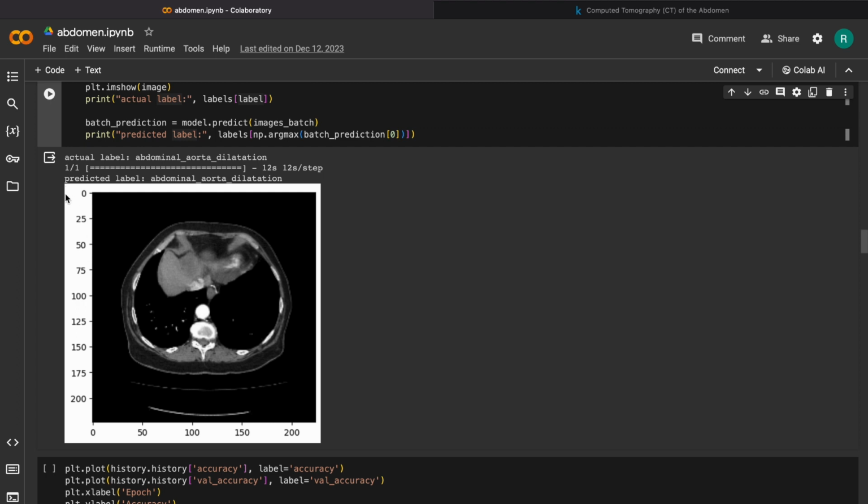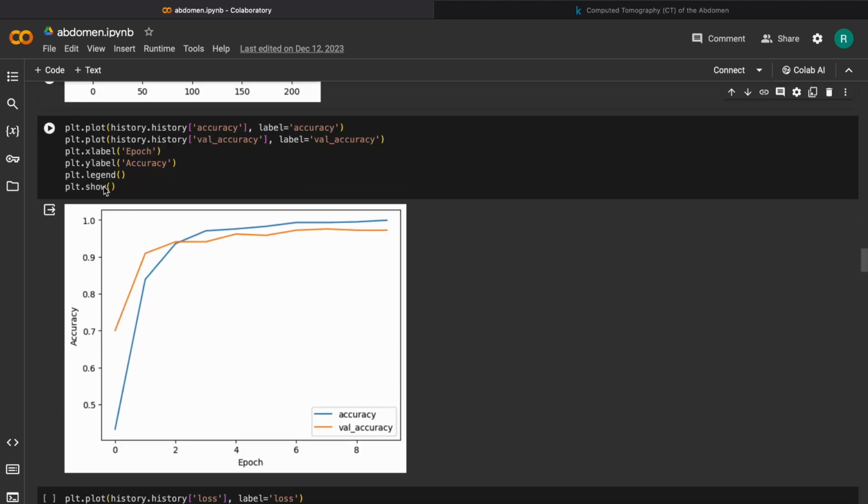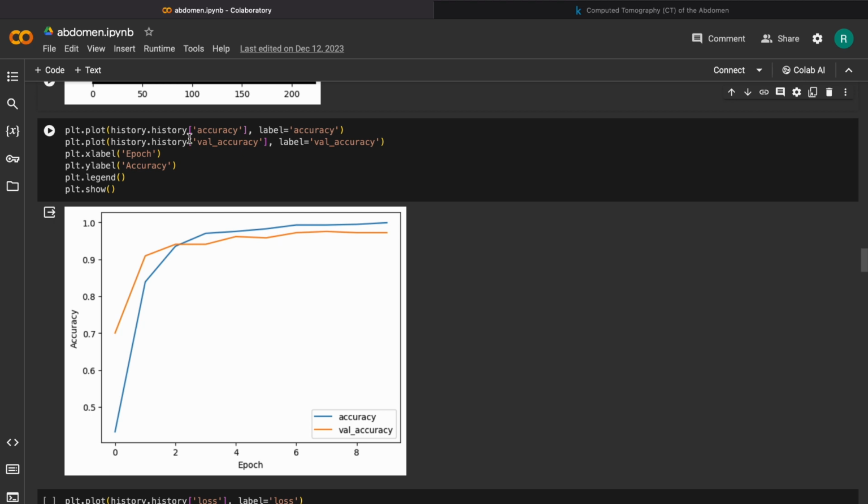So the classification was fine. What I wanted to do here is, I didn't want it always to print in just one image, right? So I will show that also. First of all, as I was telling, you should plot each and every epoch and accuracy. This is how you plot each epoch and accuracy. Like it was 10, so you have done this. If it's 100, then the plot should be much bigger, right? So this looks good actually.